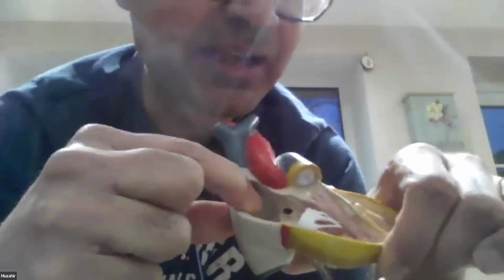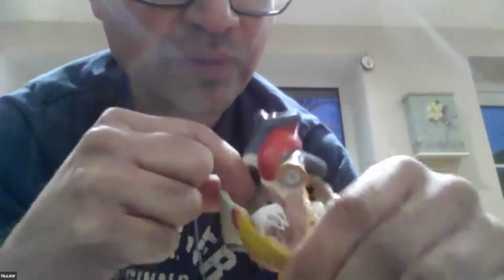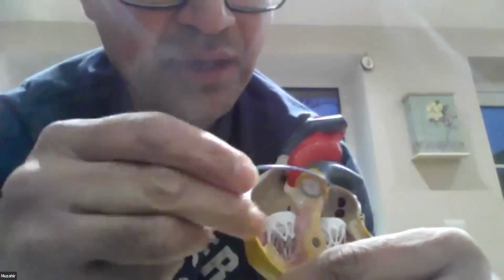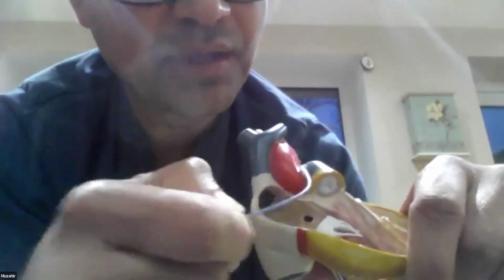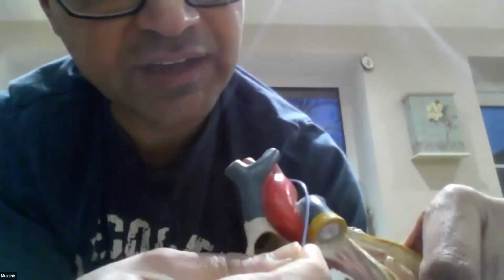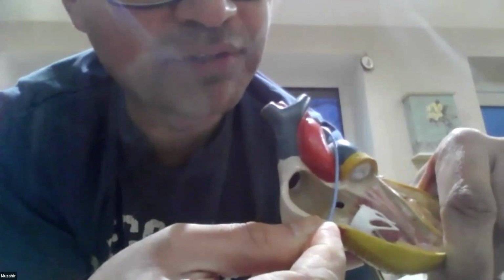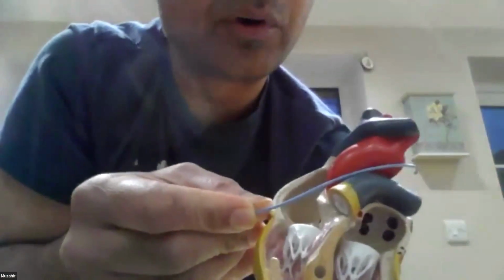One thing I just wanted to briefly explain on this model, because I think it can be useful to demonstrate, is what you see in the different views. If you look at this as in PA, the coronary sinus sits posterior in this angle. If you go RAO, the coronary sinus is posterior, and your coronary sinus view will appear upwards and backwards in this direction. If you want to open it out, you go LAO, and then you see more of the coronary sinus.